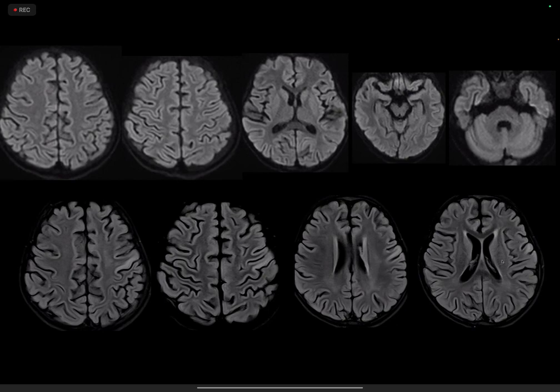You see going down medially and inferiorly, there is this hyperintensity along the subcortical cortical regions. Does not correspond with any significant diffusion abnormalities. And the rest, I cannot appreciate any abnormalities in the rest of the cortical regions. Some hyperintensity of the white matter, but again, not very significant.